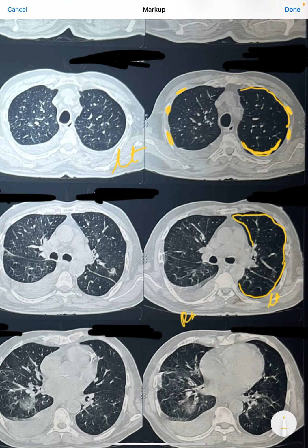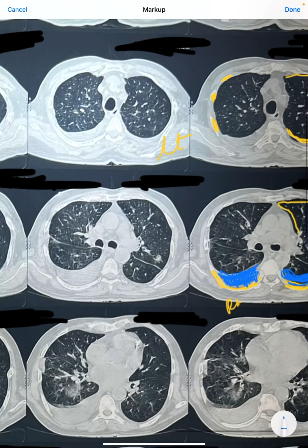but there is so much of thing in between the rib and the lungs. So this is all water, because this is taking the shape of this concavity. So this is simply settling down on this area. So this is all free fluid in the pleural cavity. So this is pleural effusion, because this is the bone. This is how the patient is lying down on the back. This is the vertebra, which we can very nicely make out. This is the vertebra. So the fluid is getting accumulated around the lungs in the pleural cavity.